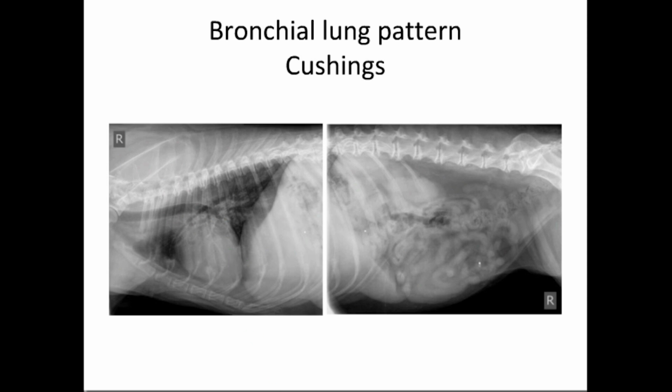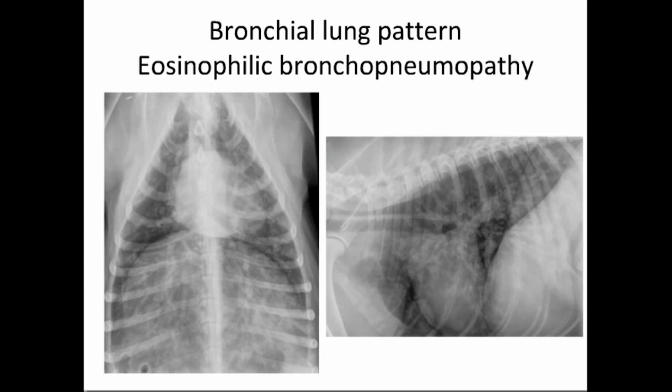So it's important to differentiate fine mineralized bronchi, which will have a certain subset of differentials, from patients that have thickening of their bronchi with the appearance, when you look at this overview, of sort of cuffs and hazy thickening around that bronchus when we see it end on. So we see here a donut, here a donut, and when we look closely we can see tram lines coming down either side of the main bronchi, and then as branches come off of them, they're all little donuts with kind of a hazy wall.